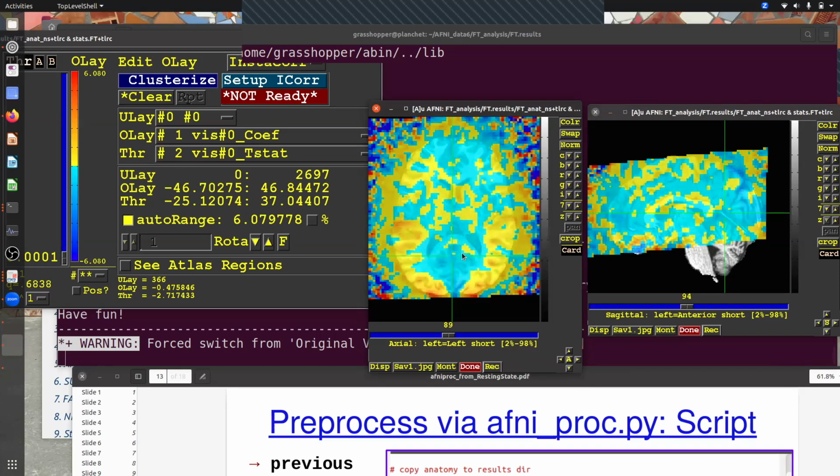Outside the brain. So that means that the air around my brain is actually pretty good at this visual stimulus, right? So even if I turn my head, I'm still seeing you because I have this halo of activity, right? Well, that's what it might look like here, which is a funny kind of thing. And what we're looking at here are the effect estimates of our modeling.